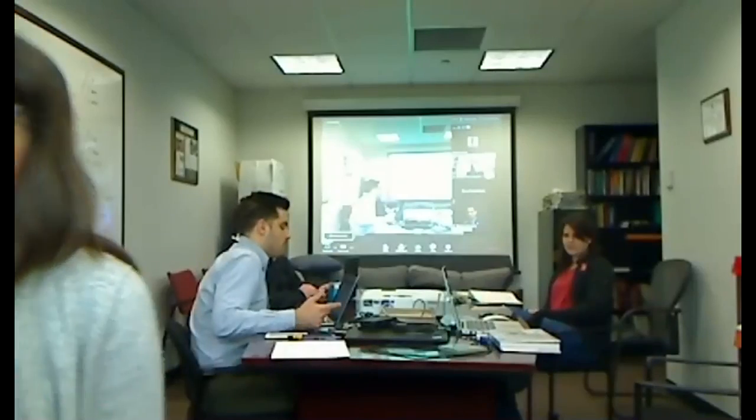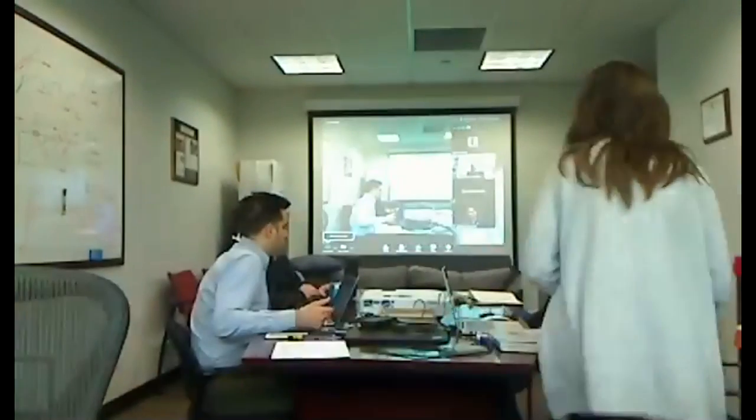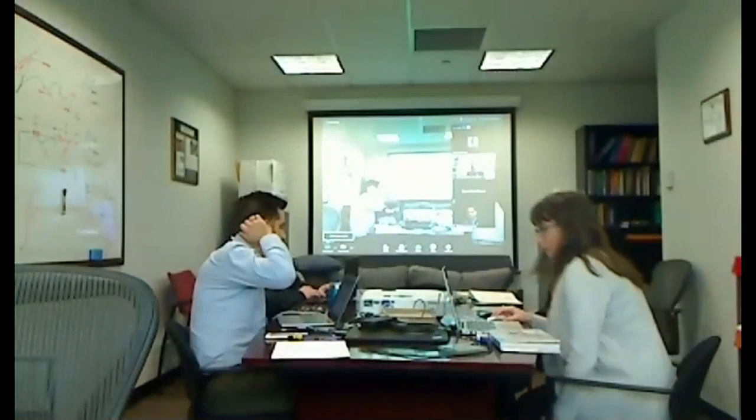Second level with the subcortical mask, so perhaps we can look at those results afterwards. Fantastic. Yes, I'm interested in looking at that as well. It doesn't really look that different to me. Right. So I wanted to comment on those results as well, the subcortical stuff, because those are related to, well, we'll get to that. So we'll talk about that later.